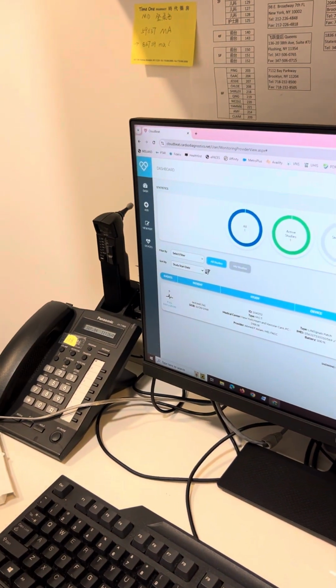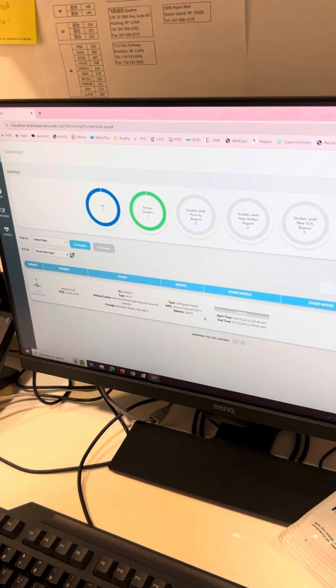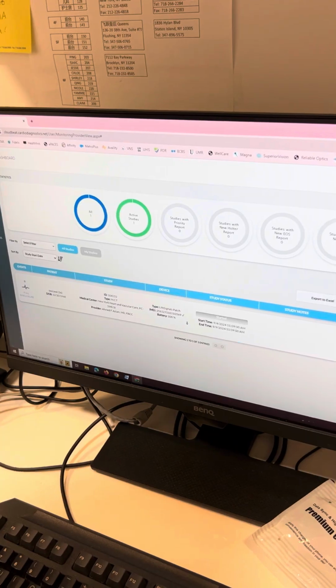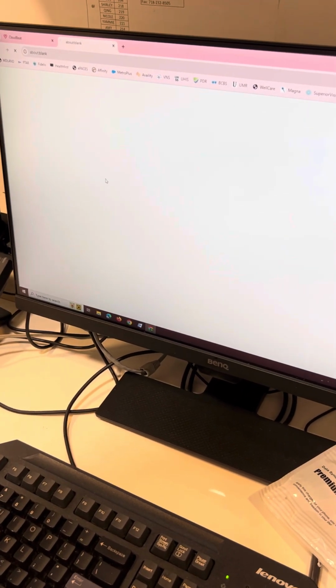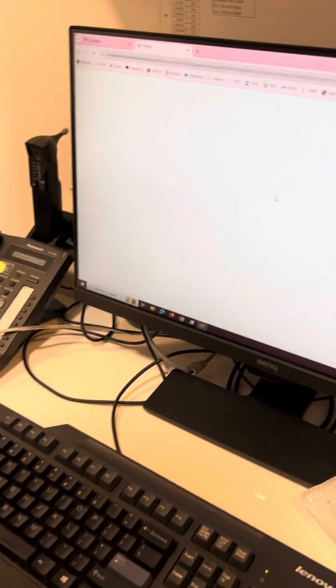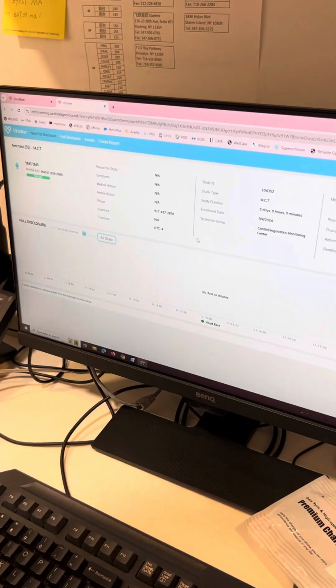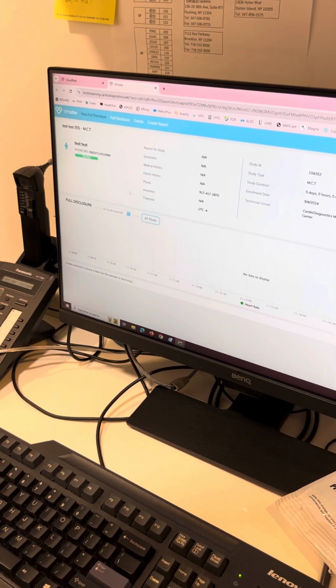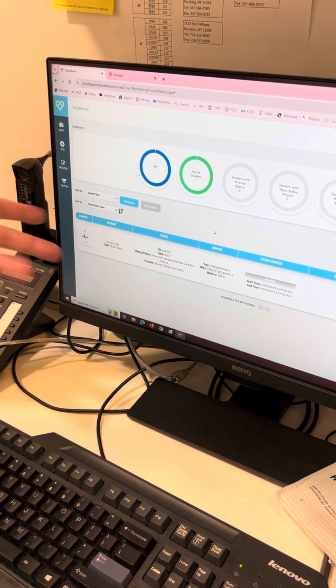And that's pretty much it. The doctor does everything else, right? The reports are all in here, but Dr. Razum will do that. All the data's in here. Like I said, it's about 5 minutes behind, so you're not going to see anything yet. But if you were bored on a Friday night and wanted to look at EKG data, it's all going to be in here. Again, it takes about 5 minutes, so it's not there yet. But if you want to check in 5-10 minutes, you click on full disclosure, it'll be there.